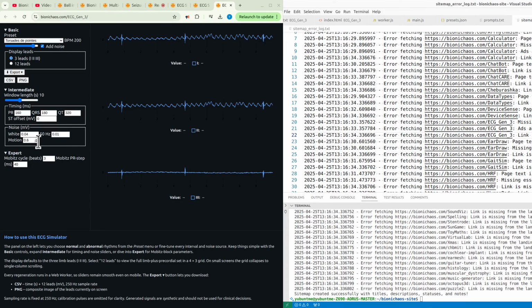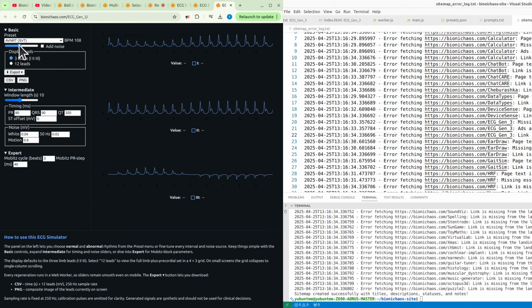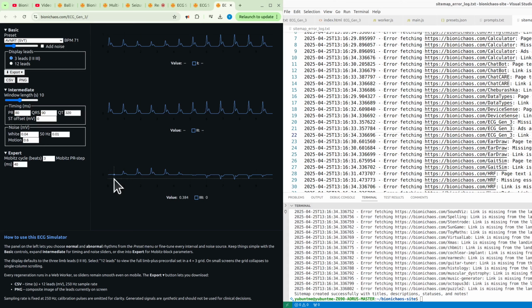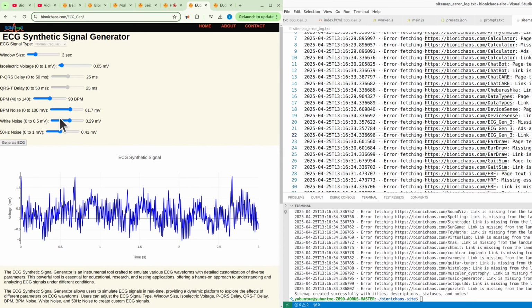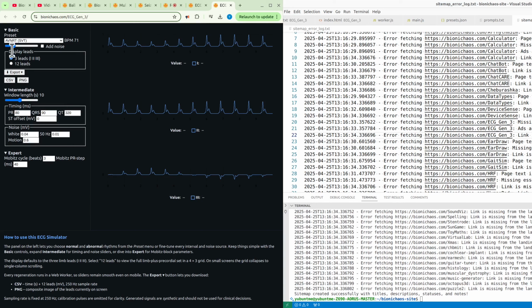We'll go from there. If we have experts in the room, I'm just an engineer, so obviously we need a disclaimer that this is not to be used for any clinical purposes or essentially anything else. We'll keep testing it. We have now a version that we tested quite a bit. It's more simple, and we'll have a more advanced one. You have a preset: basic, intermediate, and expert.